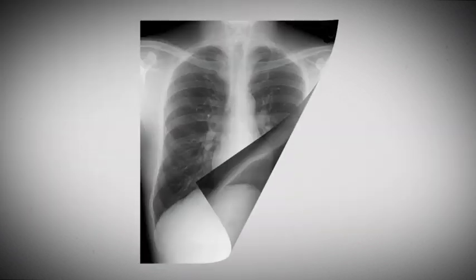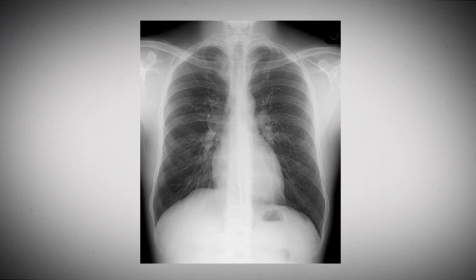To illustrate this concept by analogy, here there are four shapes: a square, a triangle, and two semicircles, all the same color. When the shapes are adjacent, they appear to form one large shape, sharing a common outer border. However, simply change the color of one of the shapes, and it is easy to see there are four separate shapes, adjacent but distinct. The same principle applies when viewing a chest X-ray. Any adjacent organs, lesions, or structures having the same radiographic density or attenuation will form a common silhouette.